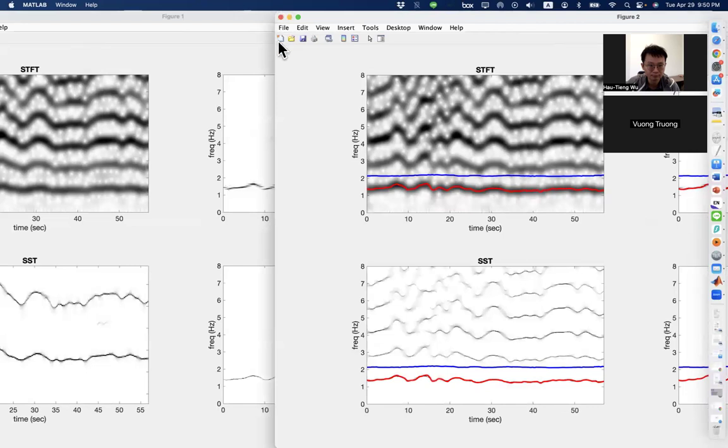So we get a first conclusion, that is, there does exist fetal ECG, but somehow in the time frequency representation, it seems to be masked by maternal ECG, because maternal ECG is too strong.